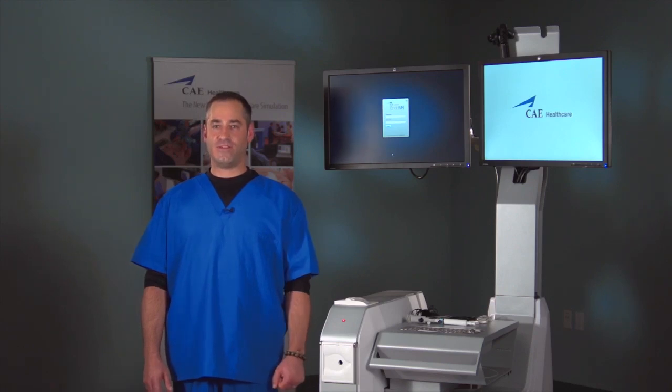When positioning the EndoVR to possible clients, it's always valuable to mention that there is a number of studies that have been published on the EndoVR and its utility in helping shorten the learning curve. There have been different studies that focus on the bronchoscopy modules and other ones that focus more on the upper or lower GI sections. As you become more comfortable with the EndoVR system, you may have some additional questions.